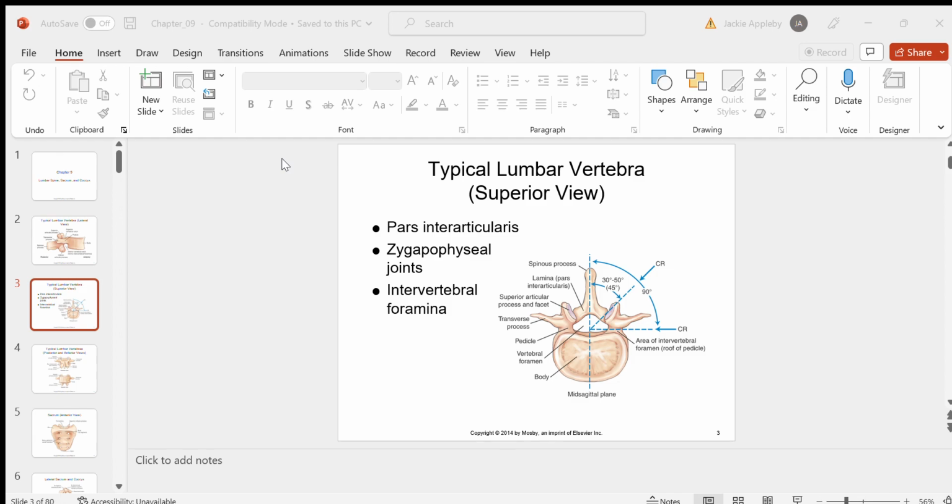So that's really important. Yes, the sacral promontory is important, primarily because it serves as the base for the entire spine to sit on top of. So we want to see the relative position of lumbar vertebra 5 compared to the sacral promontory, which would be the top of the body of the first sacral bone. We just give it its own special name. The sacrum also has its own articular facets, but only superior articular facets because everything else is now fused. We've got our articular facets here for L5 to articulate with.